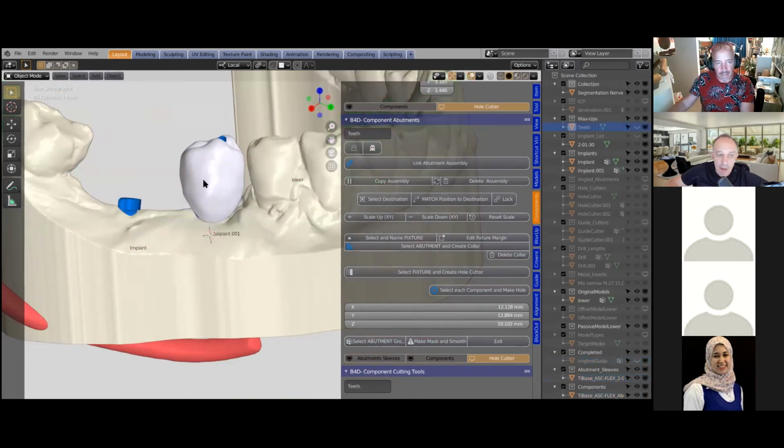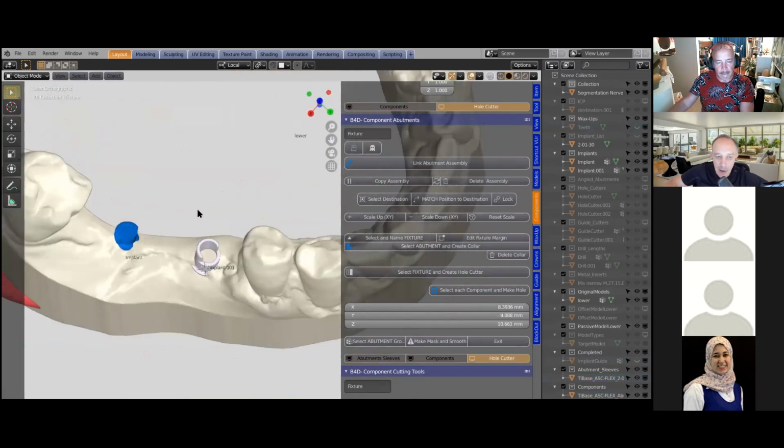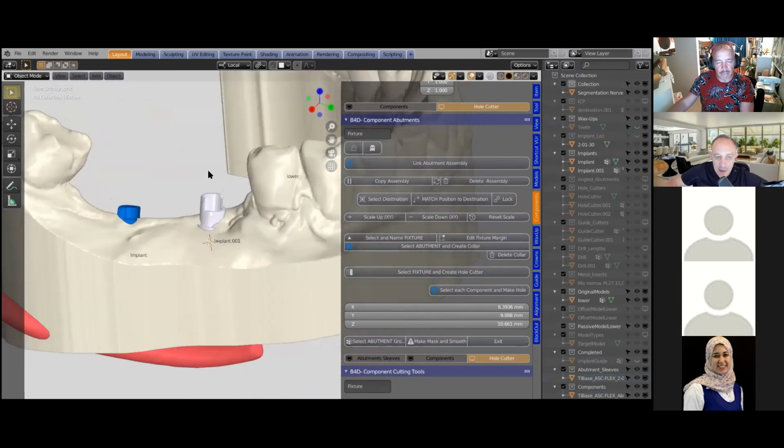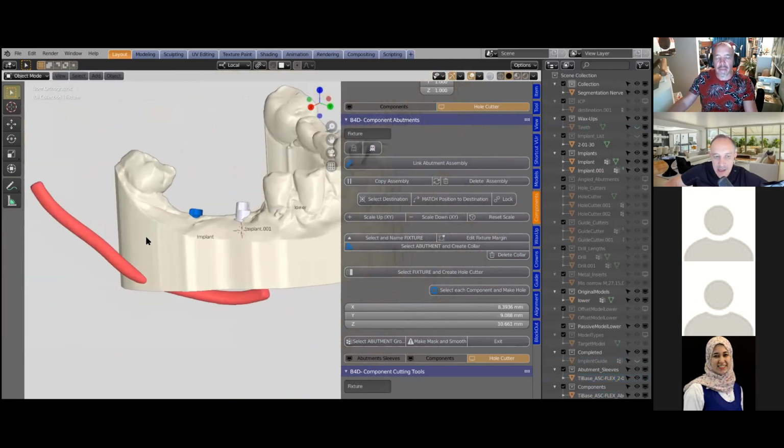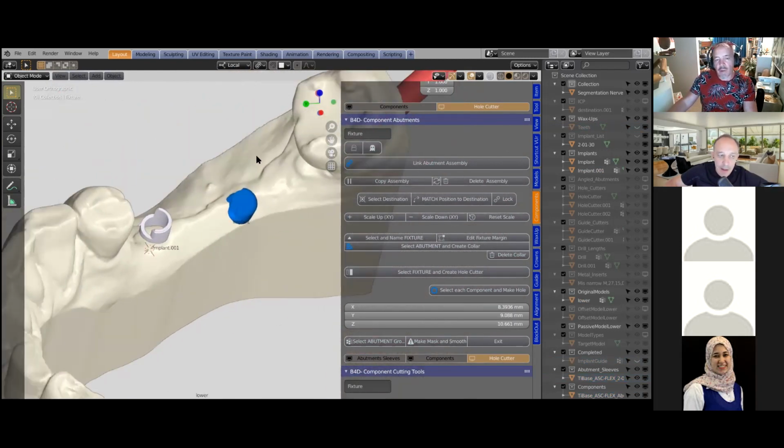Yeah, so I think that question relates to bringing the scan body and an analog into this section here, so you can make a 3D printable model. Yeah, that would follow exactly the same procedure as I've done. You're just taking the analog housing, because we've got housings, like analog housings, and then you're going to extrude it, and we've got the video in the component module.